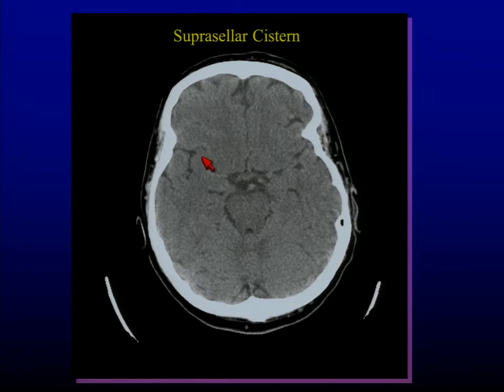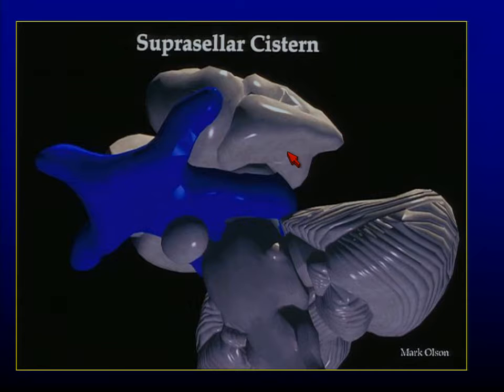Another cistern, just because we catch it here, is the Sylvian cistern, and this is the third one that I'll mention. The Sylvian cistern lives out here, and that's the very distal area of the middle cerebral artery. If you're only going to remember 3, ignore this one, but if you're going to remember 4, keep this one in the fold. You can have distal middle cerebral artery aneurysms that only leak out here into that Sylvian cistern, and they don't reflux blood back into the suprasellar cistern. So you can see subarachnoid hemorrhage that shows up just out here in those Sylvian cisterns. It's pretty uncommon, but I've been doing this for 15 years as an emergency physician, and I see it maybe once every other year where somebody has subarachnoid only in that particular region.